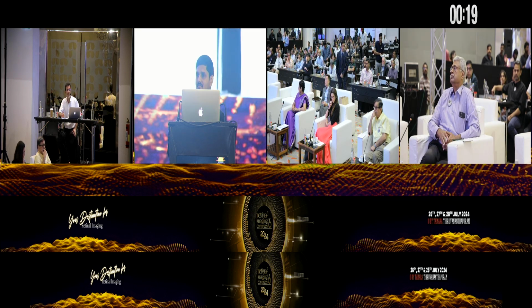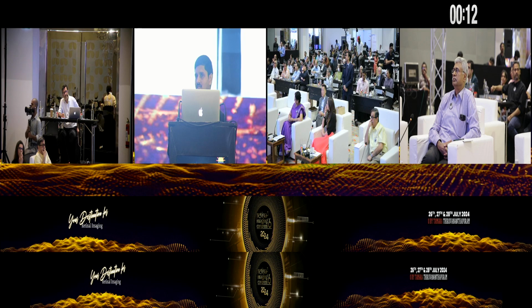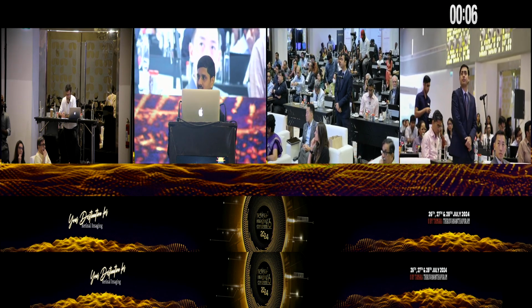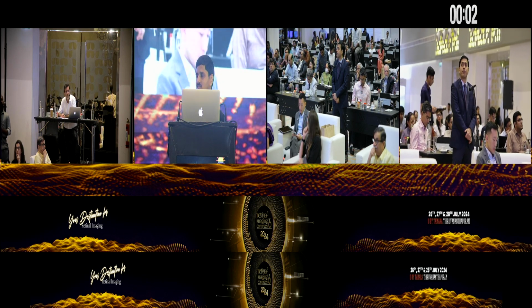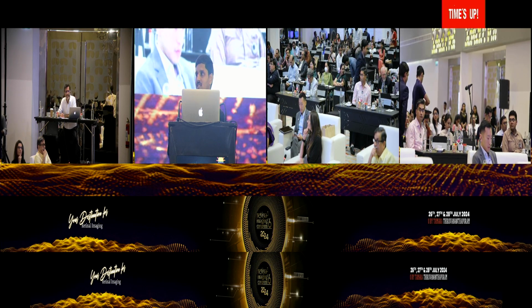As the biomarker to worry about the most, as Dr. Apur was mentioning, the intraretinal hyperreflective foci is something which even I consider has a higher risk, as most of the articles are also suggestive that it has a higher risk of progression into GA. And even the thin DLS, which is not a quiescent MNV. So a thin DLS is something probably associated with higher risk of progression to GA.